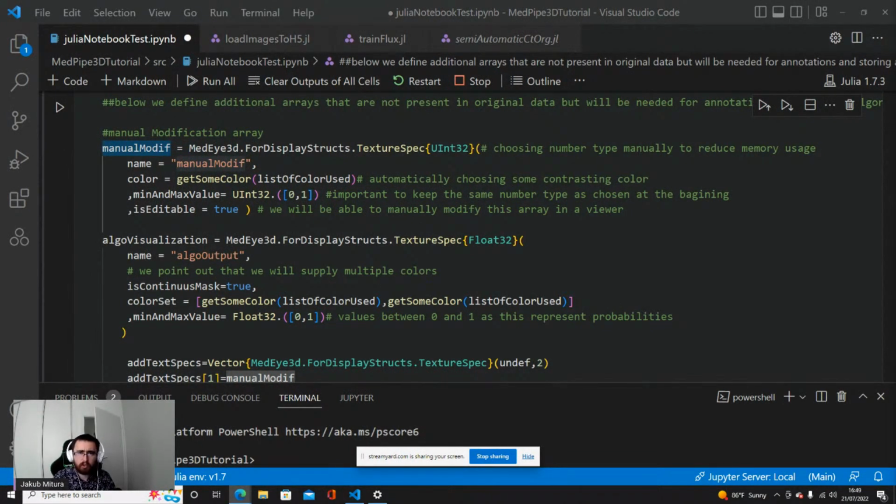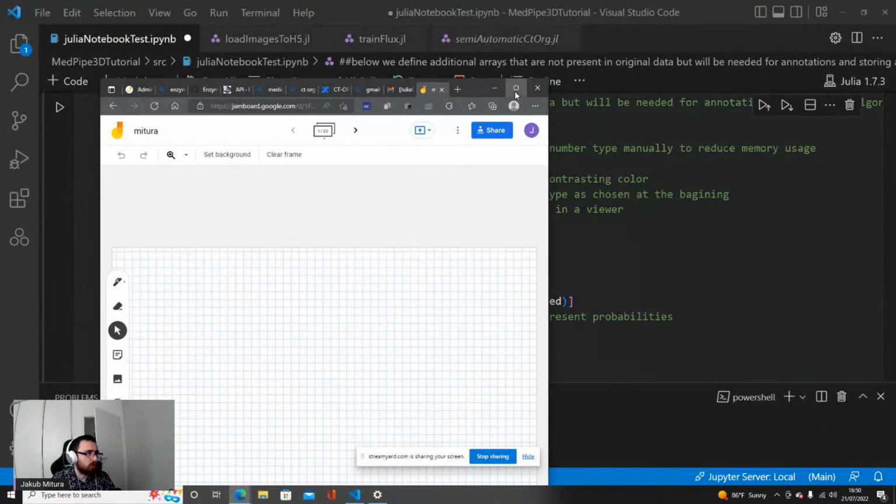In case of my viewer, all of the data is stacked on its own. I just will show something. Okay, for a moment, this one would suffice.